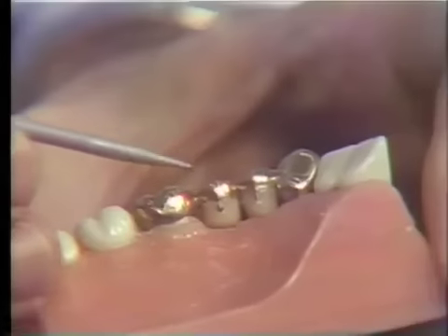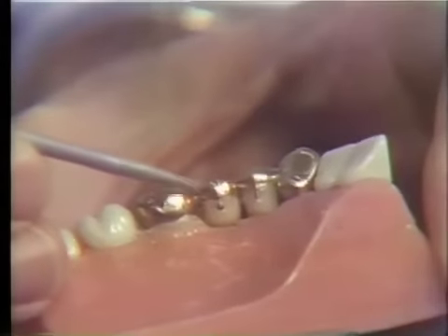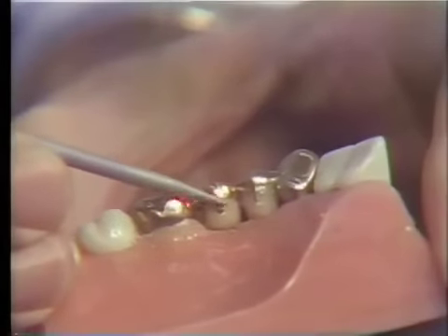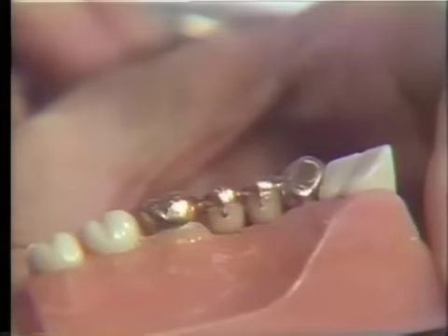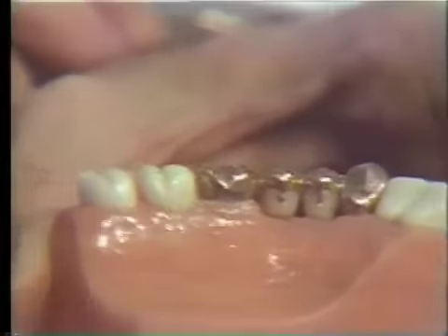If you like, you can develop a similar apron of gold over this area here by hollow grinding in there, much the same way as was done with the Steele's flatback facing. So this then is the Steele's true Pontic, and you saw 2 bicuspids being replaced in that particular situation.